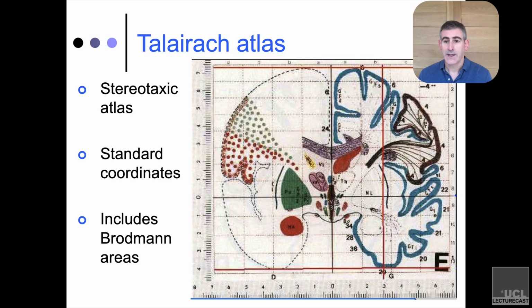And I say, okay, I had a coordinate of X equals 56 and Z equals something which I've already forgotten. But 56 is 5.6 centimeters. I can just look on the x-axis to 56 and then go up to whatever the z coordinate is, and say, oh, look, that puts me in the superior temporal gyrus, for instance.